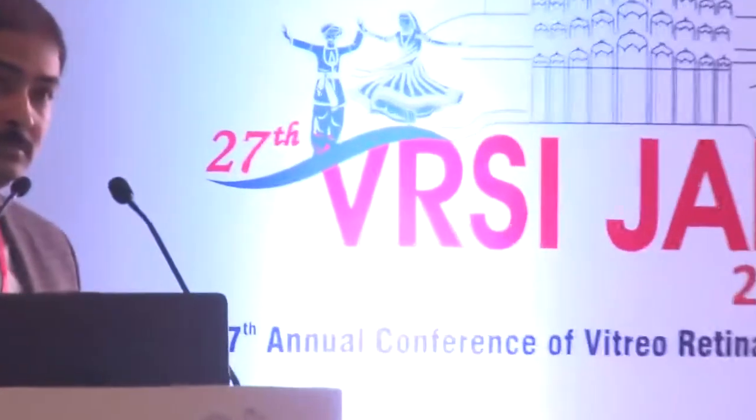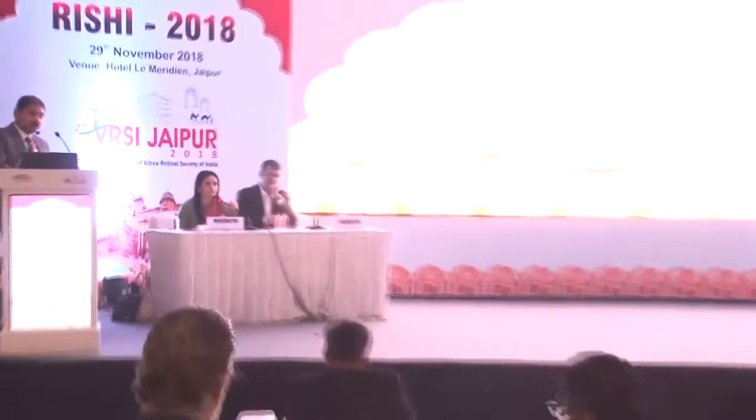What was really surprising is that if you magnify these scans, you actually see a continuous inner nuclear layer and inner plexiform layer going across the fovea. The obvious response would be to say this is just traction, bringing the layers together from either side. But with very high magnification, there seems to be a very continuous inner plexiform and inner nuclear layer.